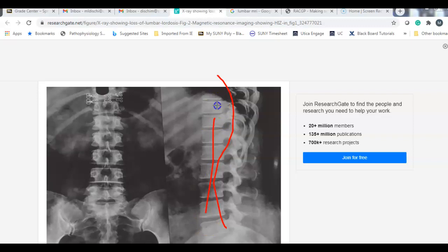This patient with such a straight spine is causing a little abnormal pressure on this low back. So they're getting bone spurs, also known as osteophytes. You're getting a little bit more compression on this vertebra because it's getting more pressure than it should be.